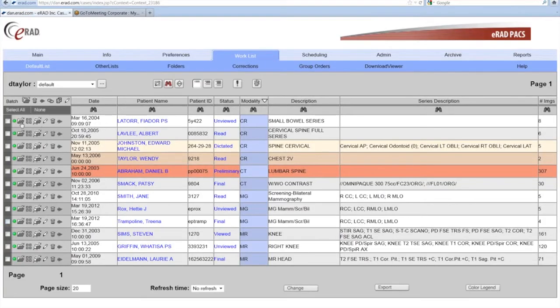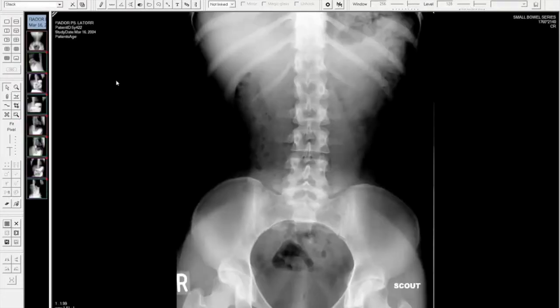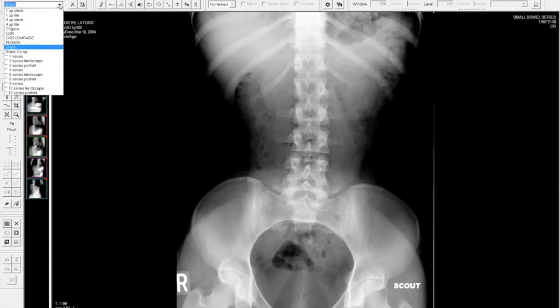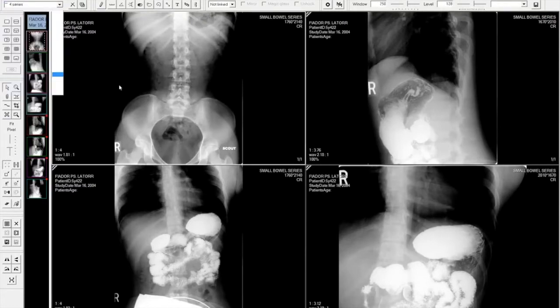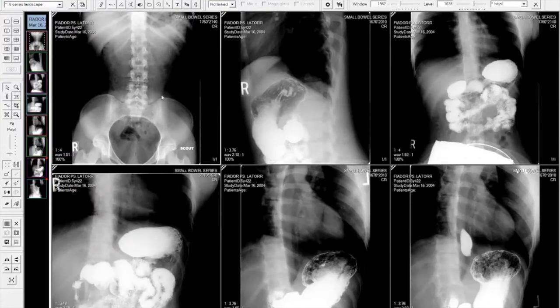Now, I don't need to use anything sophisticated unless I want to. Now, I have my stack hanging protocol, but you'll notice in the top left where I have these hanging protocols described and saved, there are default display mechanisms, and all I have to do is simply choose one of the default formats, and if I'm happy with that, the system will remember this type study wants to open in this display format. It's not anything that I created, it's simply a display format that is part of the system.